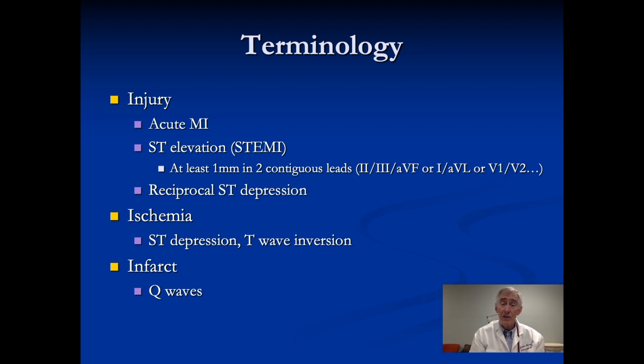But this is not the same as a STEMI, ST elevation MI, in which we see elevation implying injury, and it implies a transmural cardiac event, transmural damage. Now, we oftentimes will hear if there are significant Q waves of greater than 30 milliseconds or about 1 millimeter of length to the Q wave, or if it's 25% of the following QRS, then we call that a significant Q wave and it implies infarction.